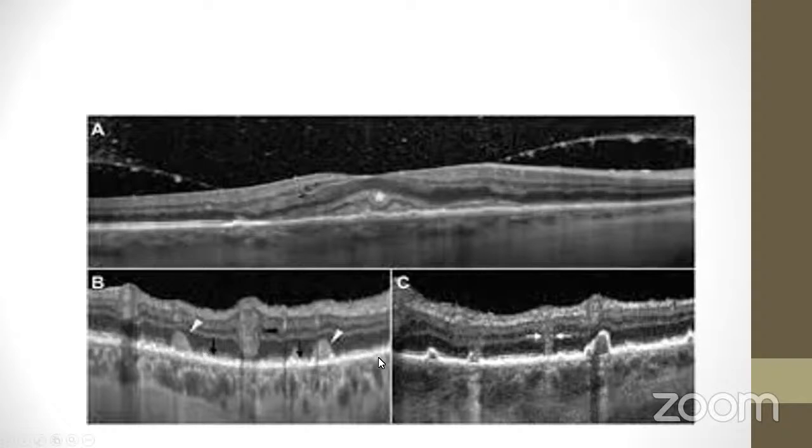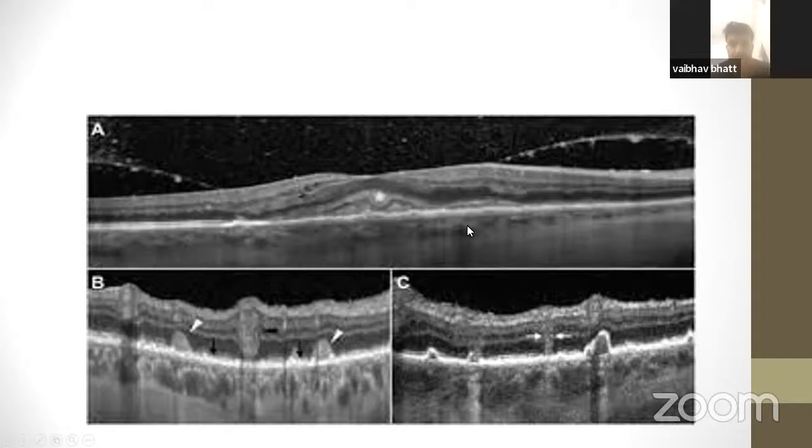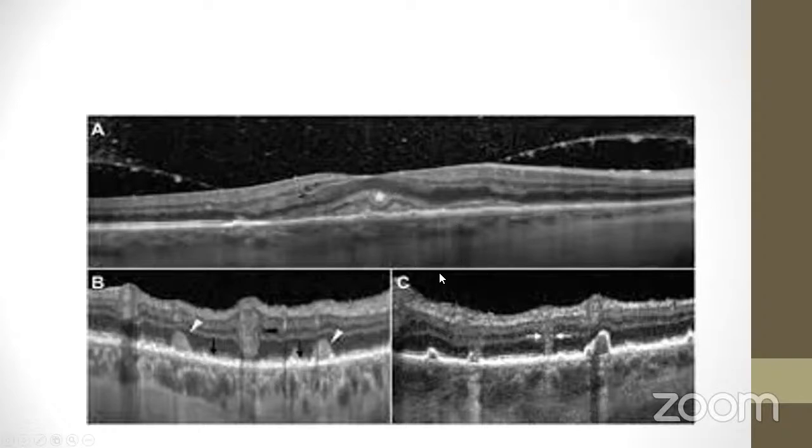And the latest change which has been shown in PVRL is in the center in C, which is these vertical lines which traverse the retina. So these are all basically lymphoma cells which are growing here. As we all know, primary vitreoretinal lymphoma will commonly occupy the space between Bruch's membrane and the RPE. Choroidal lymphoma, on the other hand, will grow in the choroid, so it will be at a deeper level. This is not a picture of choroidal lymphoma. These are pictures from a primary vitreoretinal lymphoma. Please go ahead.